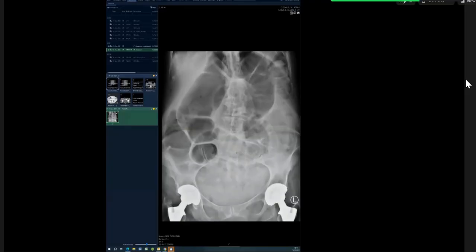So how would you differentiate small bowel from large bowel? Small bowel is more in a central location, with valvulae conniventes, and the colon has haustration and is more peripheral. So is this haustration? Do you think you see the same pattern that you see in the central loop as well as this one?